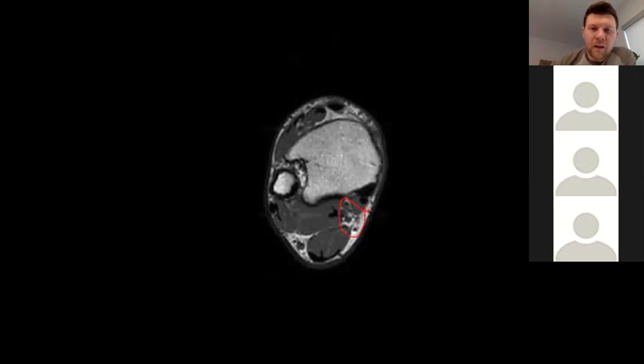Other things we can see is as we come, sorry, my mouse disappears, so I'm trying to draw blind. Right in here, what nerve might be in that little bundle? Like sural. Good. And if we come more anterior, you can start to see what's in there. Like anterior tibial, maybe turning to dorsalis pedis. Okay, good. It's okay if you just say your anterior neurovascular bundle.